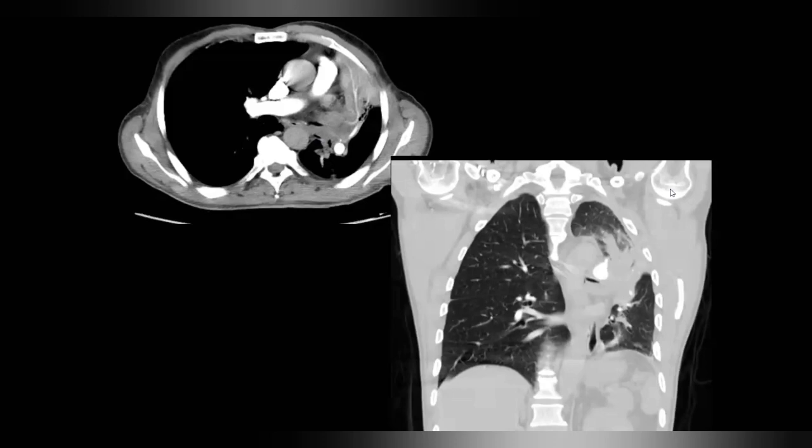Okay? Yes, sir. Thank you. Good. So remember, this is the prototype of lobar collapses. You have to understand and memorize lobar collapses very well. The most difficult of them will be the left upper lobe collapse. The second most difficult will be the right middle lobe collapse.